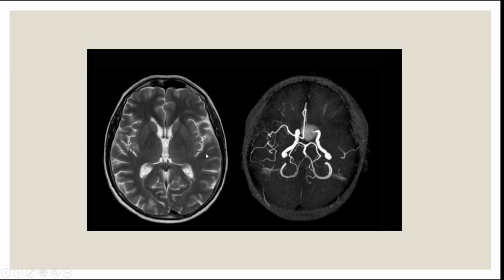And usually in MRI, it depends if it's T1 or T2, there should be something that is hyperintense. Usually, if you see the ventricular system, it's more likely to be an MRI, a T2 scan, because there is brightness of the water.